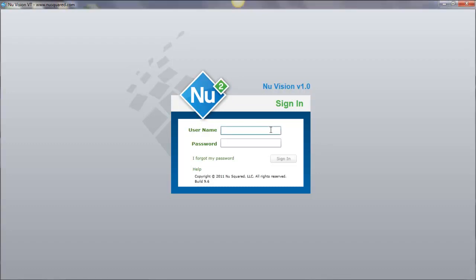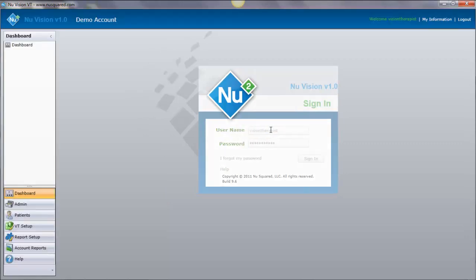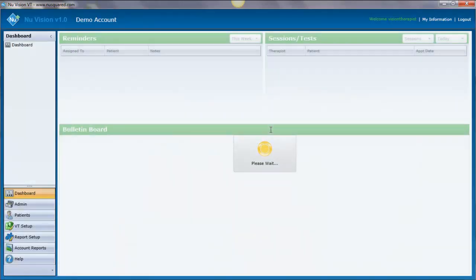This video will demonstrate how to perform vision therapy sessions and assign vision therapy homework in the new Vision VT software. Begin by logging into your account. After logging in, you will see the account dashboard screen.